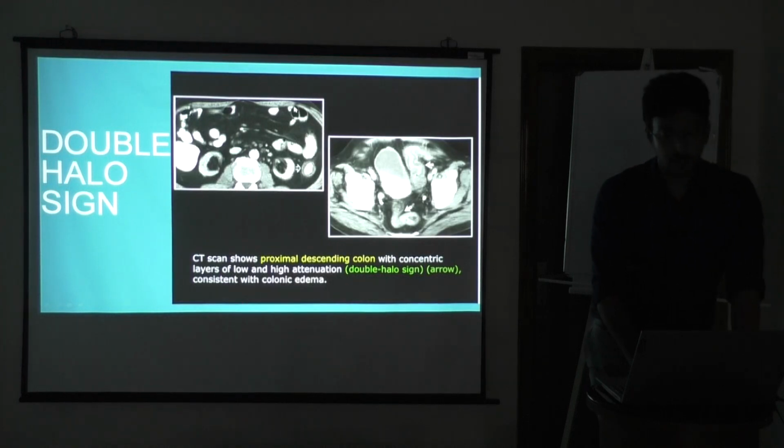I'll compare. Okay, you can see this bowel loop. So how the wall is, one nice white line is there and the gas is there. That's how the normal bowel should look. But in this case you can see this is the contrast and how big the blackish thing is. So it is not enhancing, that is called hypoenhancement of the bowel wall. This is a typical feature, and the reason why it formed is because of the submucosal edema.